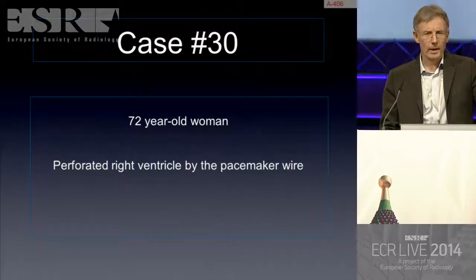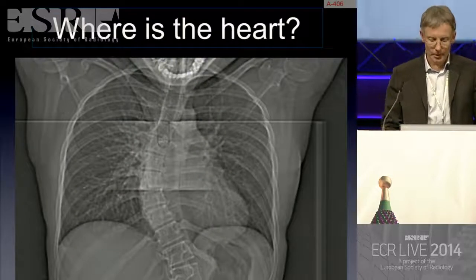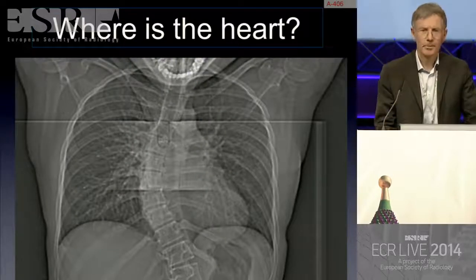Perforated right ventricle by the pacemaker wire. So remember to look at the wires. And I'll go quickly through a couple of cases to finish. Sometimes the patient helps you.